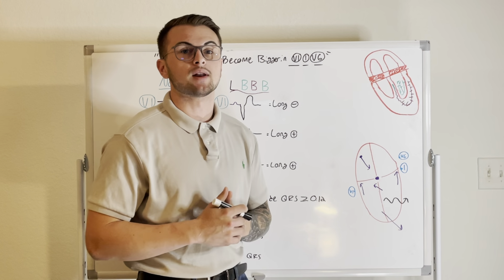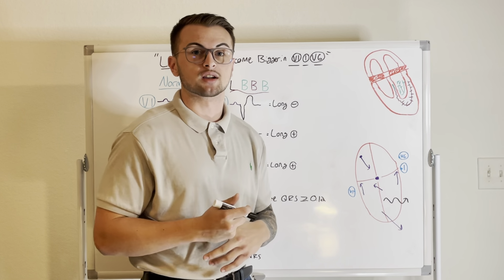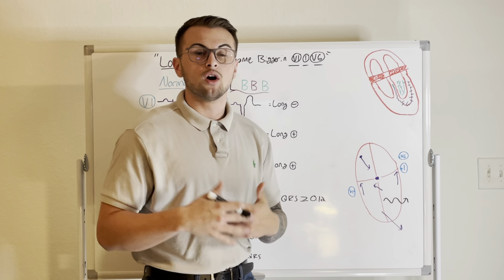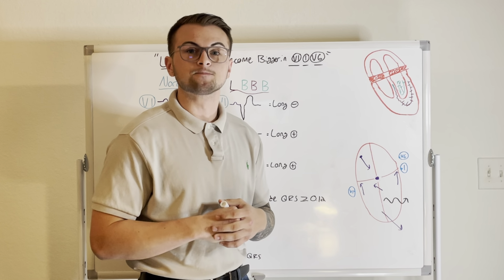And it can also just be benign or idiopathic, so the patient could have always had this. That's why it's really important to get serial EKGs and then compare them. So that brings us to the golden rule of EKGs: always read them in context of your patient's history and presentation. So never read them just in a vacuum.